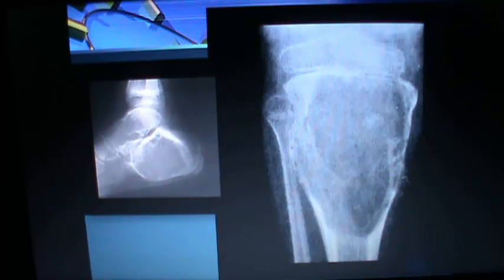This osteolytic lesion is seen expanding the proximal tibia and limited by the epiphyseal plate. And this is an example of aneurysmal bone cyst. Again, if you see the os calcis, its inferior margin is bulging down, and that is a blown-out tumor. It is again aneurysmal bone cyst. The matrix in both is not calcific. The cortex in both is markedly thinned, and these are the characteristics of the aneurysmal bone cyst.